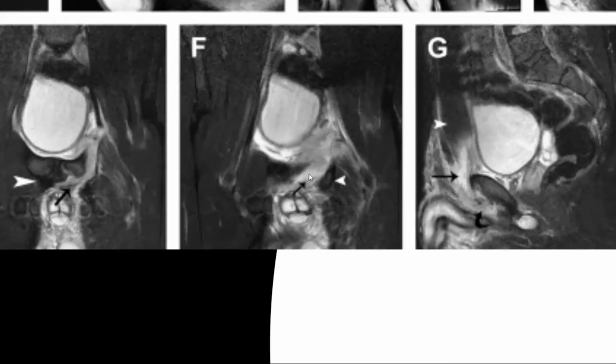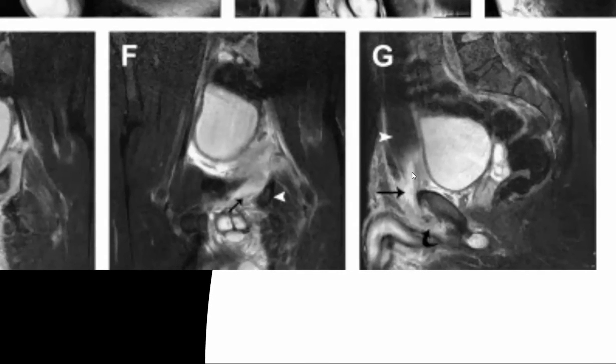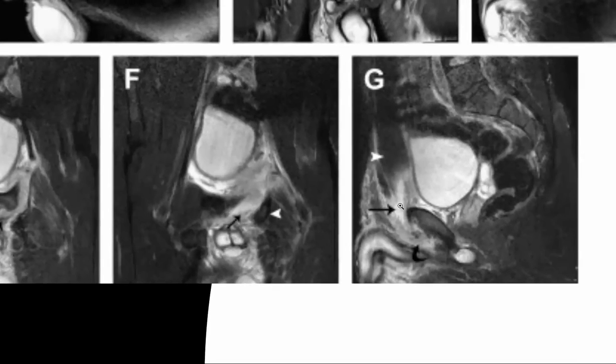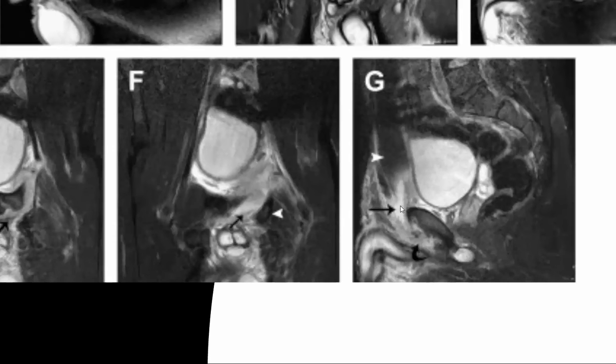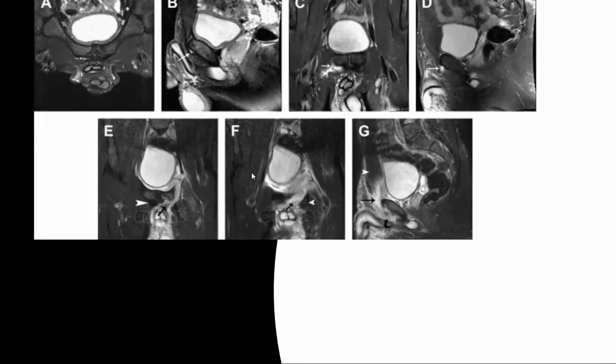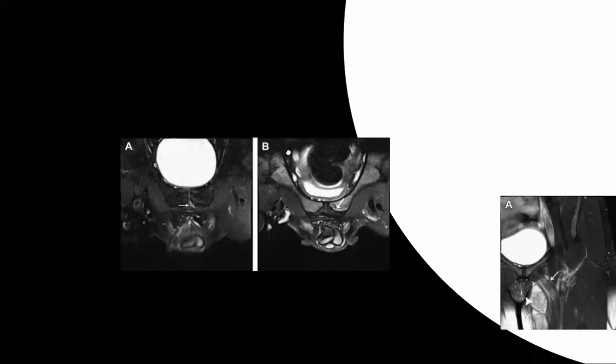Here it is, a much bigger example of it. And here is severe edema of the distal rectus abdominis, really a lot of inflammation. That's really been pulling quite chronically for whatever sports reason, causing lots of inflammation. So a lot to take in, but the take-home point here is that the sports hernia has many different causes.